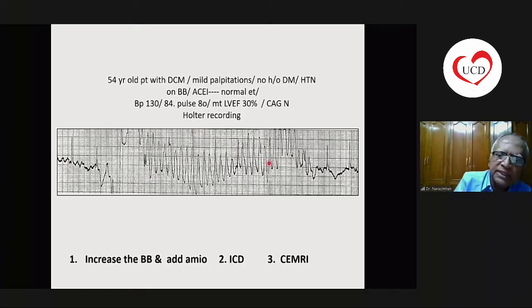So for this person, if his MRI is normal, there is enough data following the Danish trial that if MRI doesn't show a scar in DCM, there is no urgency to put an ICD. We can manage them with medical therapy, except for some exceptions, but we'll come back to it. So this turned out to be an artifact.